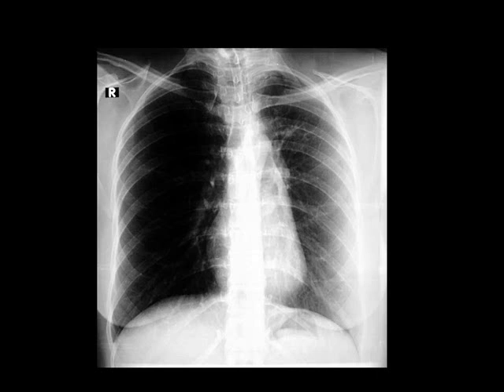And if you look at this chest x-ray, you can see that there is either hypertranslucency on the right side or veiling on the left side. And there is no pathology on both sides. This is because of the patient tilt.